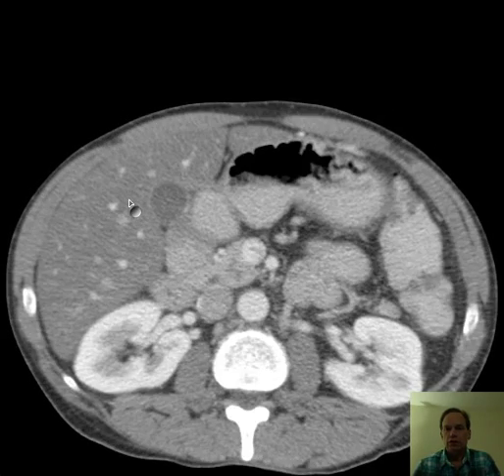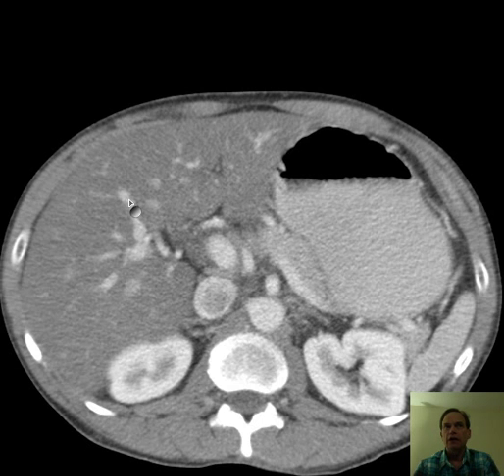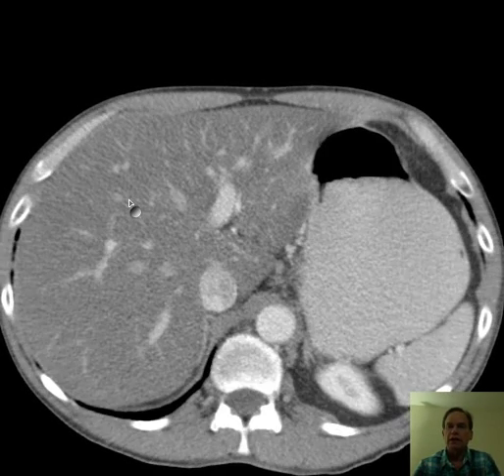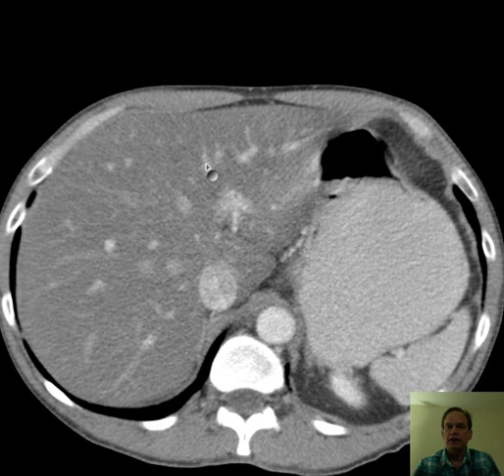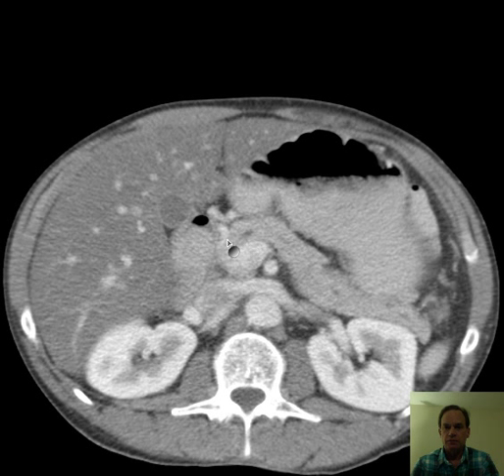So that's the liver: low attenuation, hepatic steatosis. We see it on ultrasound as a brighter or higher echogenicity of the liver. That's called hyperechoic, a bright appearance on ultrasound when the liver is infiltrated with fat. Remember, fat has a low attenuation. It's dark, and so the more fat you have in an infiltrated organ, the lower attenuation you'll expect it to be.